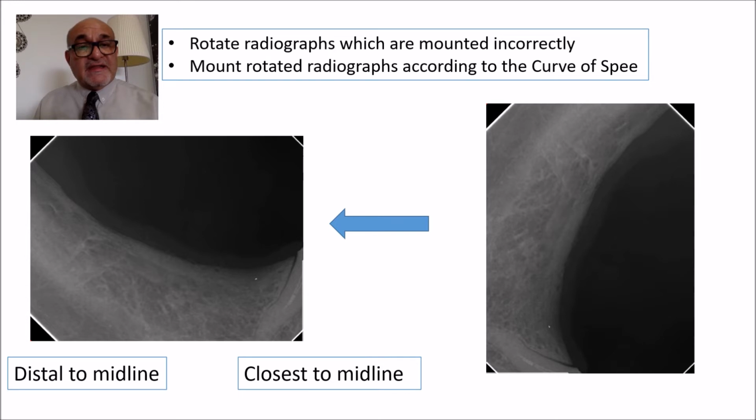You will locate it again from the direction of the occlusal plane. Here you can see a trace of a lower canine. Okay, all the other teeth are lost. Now, if this is the midline, then your arrow directed from the midline distally is extending to the left. So this is the right side of the patient. Mandibular right side of the patient.